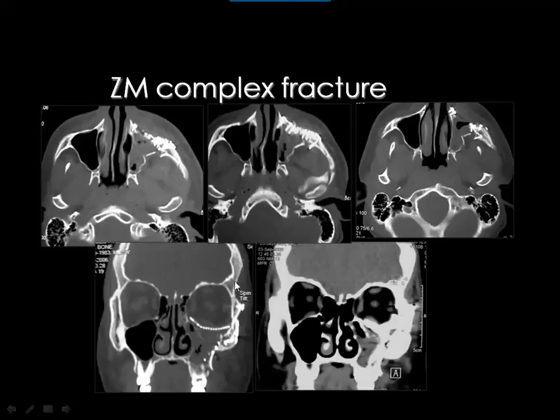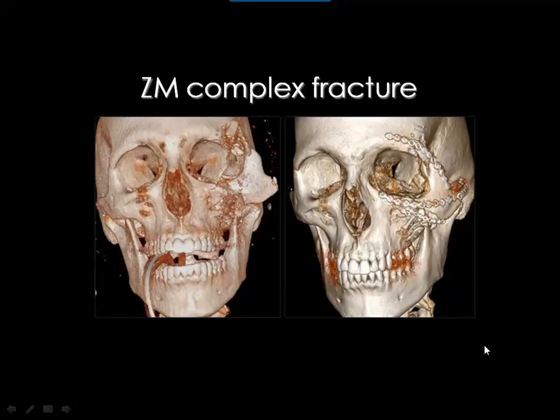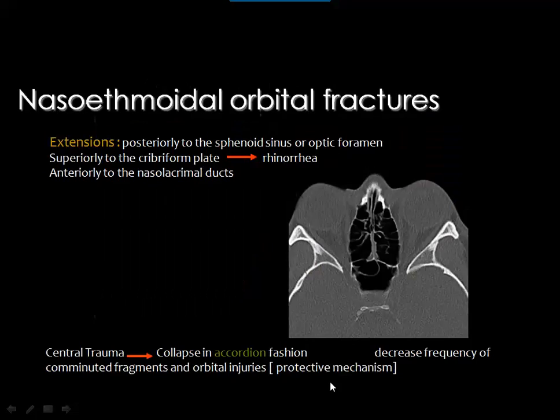Then if you are confronted by a case like this, forget about these comminuted fractures. Forget about that the zygomatic arch is still fractured. All these are nonsense. You only concentrate on your report at the position of the zygoma and the sealing of the orbital floor. These are the very important issues. Then this is the fracture by 3D before surgery, and this is the reconstruction after surgery.